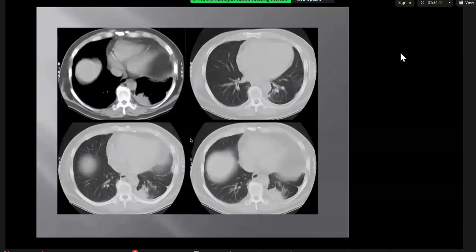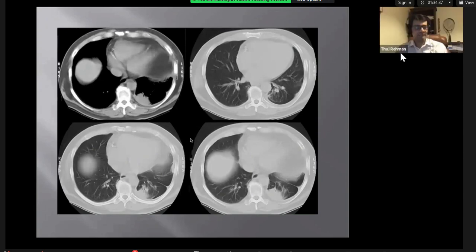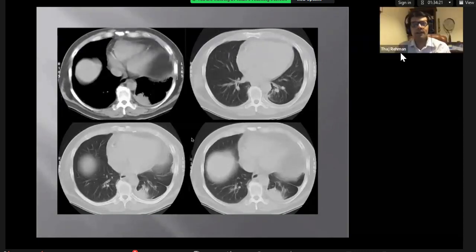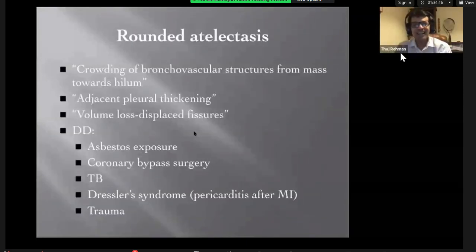Okay, so I can see in the CT there is a pleural-based soft tissue dense lesion with linear markings radiating from the lesion towards the lung. So this is folded lung. Yeah, that's all right. You got the diagnosis.